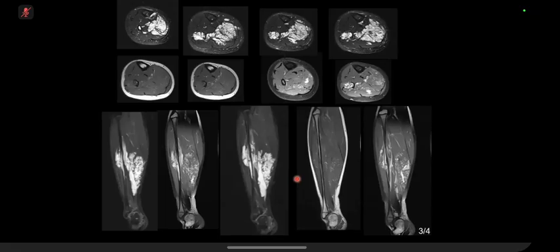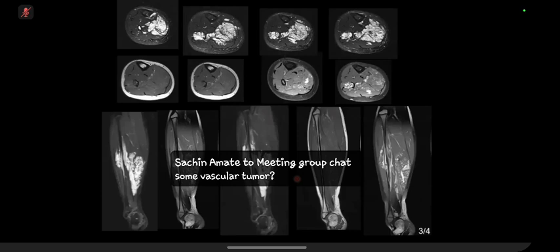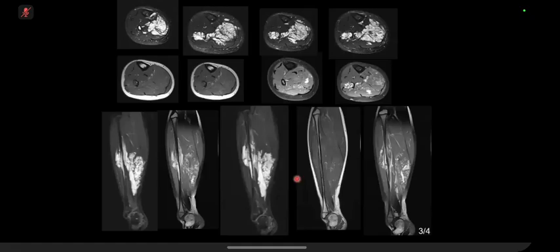There is also a bit of periosteal reaction around the fibula. These are highly concerning features for an aggressive tumor, and for example in this patient, I would refer the patient urgently to the regional sarcoma MDT.